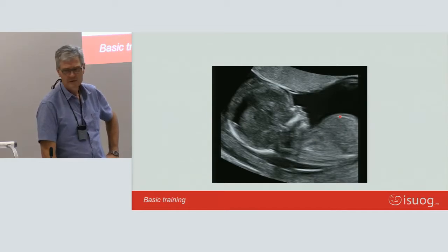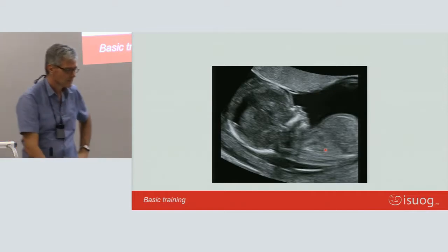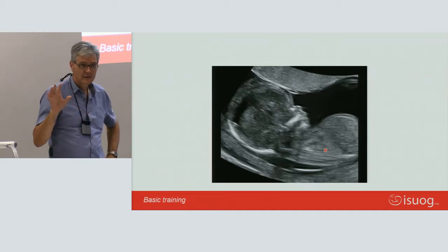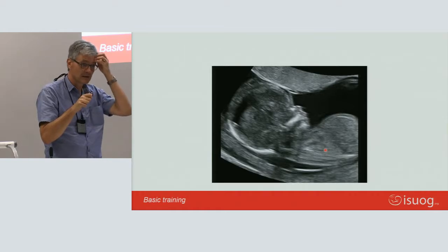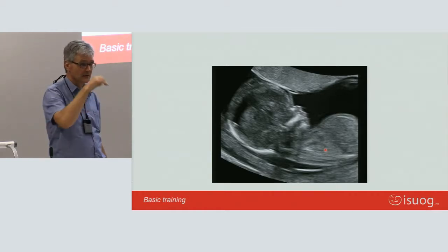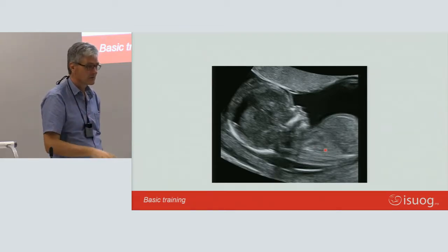It feels like a really, really long time since New Year, but it looks a bit like a champagne cork: the narrow part of the chest and a big part of the stomach. So again, not something that you should put this label onto the patient. And the same as Douglas said, you don't tell this girl of 18 that she's going to have several miscarriages if you see an arcuate uterus.